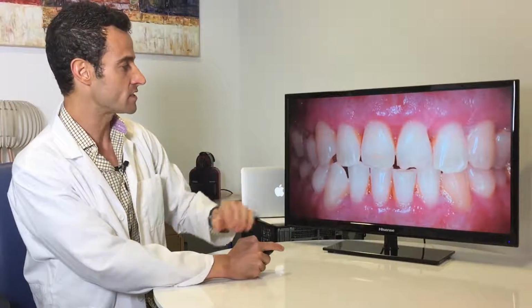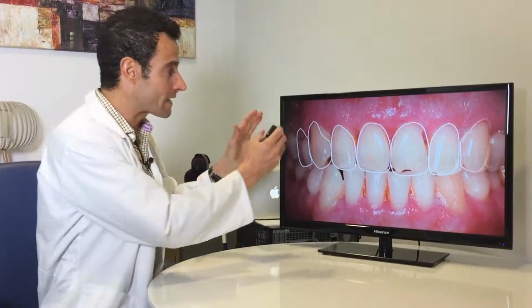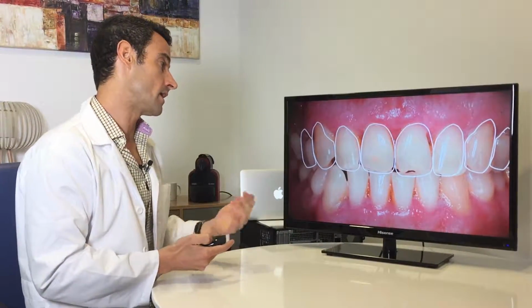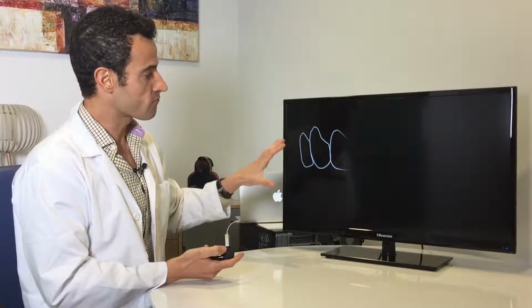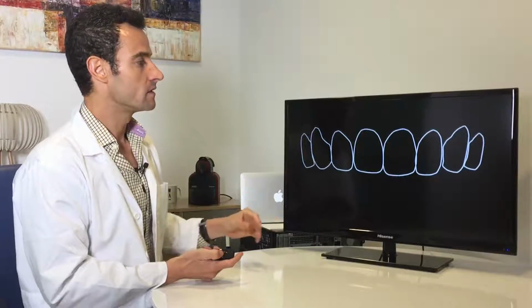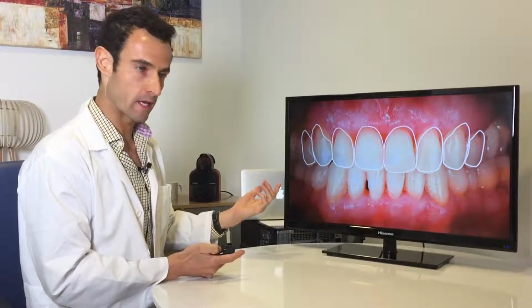And this is the verification that I did at the beginning, but to get this result, it was really important first to do the orthodontics, the planification that we did, and after that, this is the result that we got in the case.